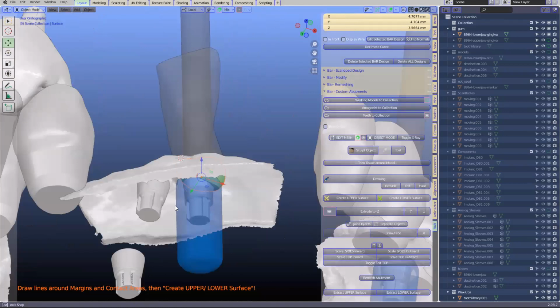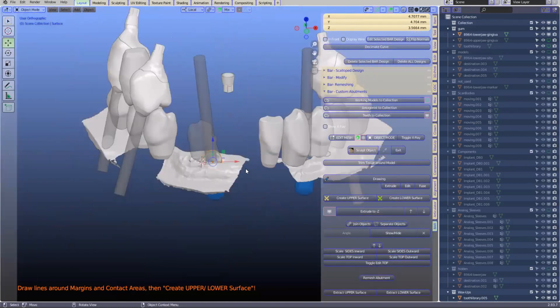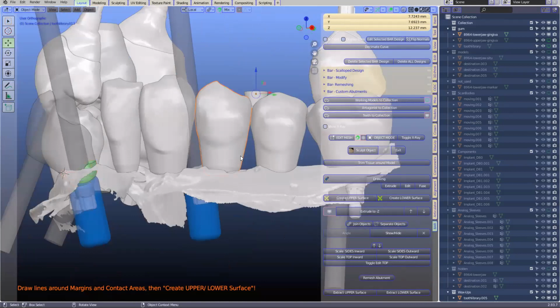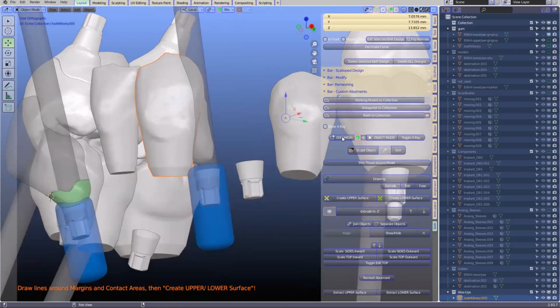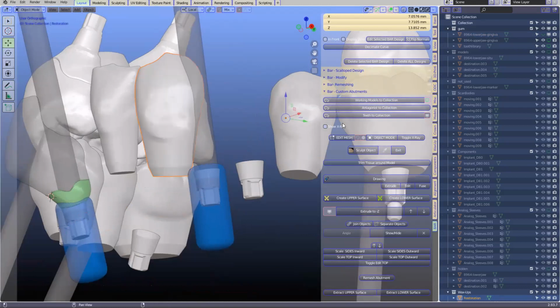Okay, then with it being selected, look at it from the top. Actually, we can't look at it from the top because we've got two, because we're making a bridge, remember? So this one here, we need to do as well. That's right, because it's part and parcel of a bridge. Okay, so I don't like this mesh. We'll just remesh that like that.